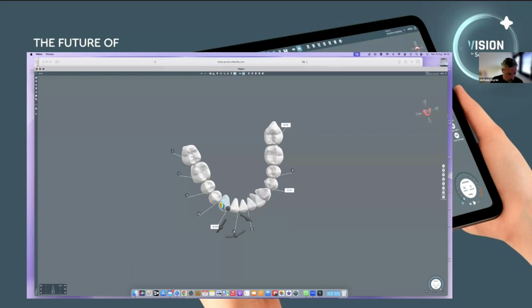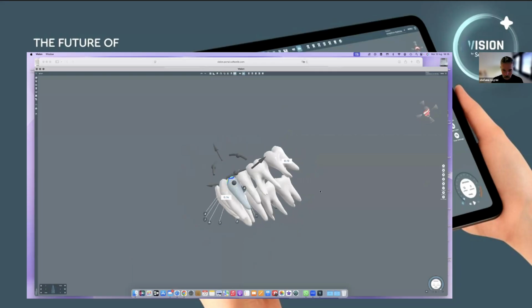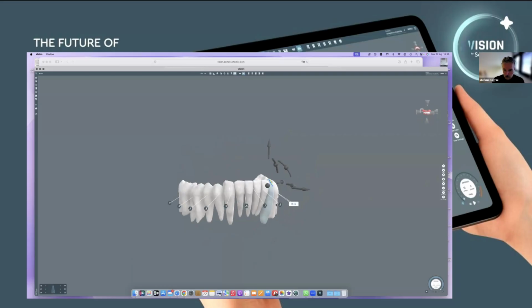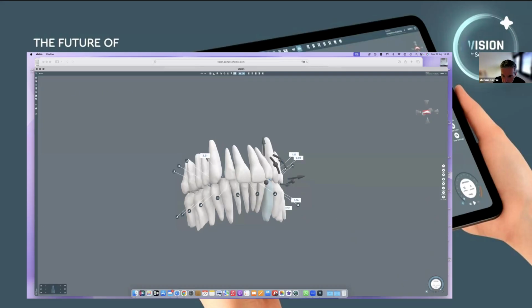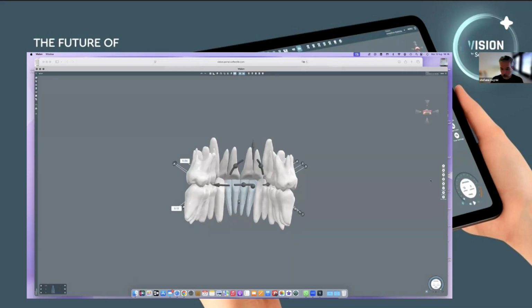I like to use the hinge all the time just to manage. Okay, side like this. I want to go this. I like to check this at the moment. Let me check. Okay, check it.